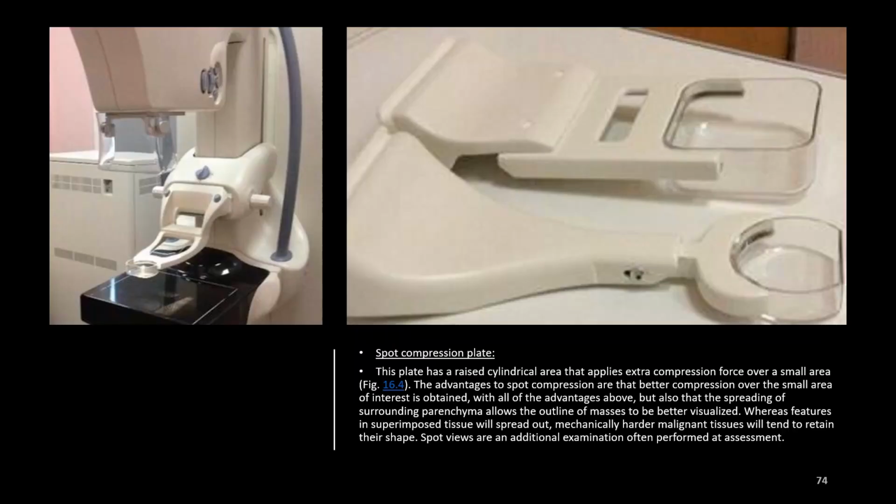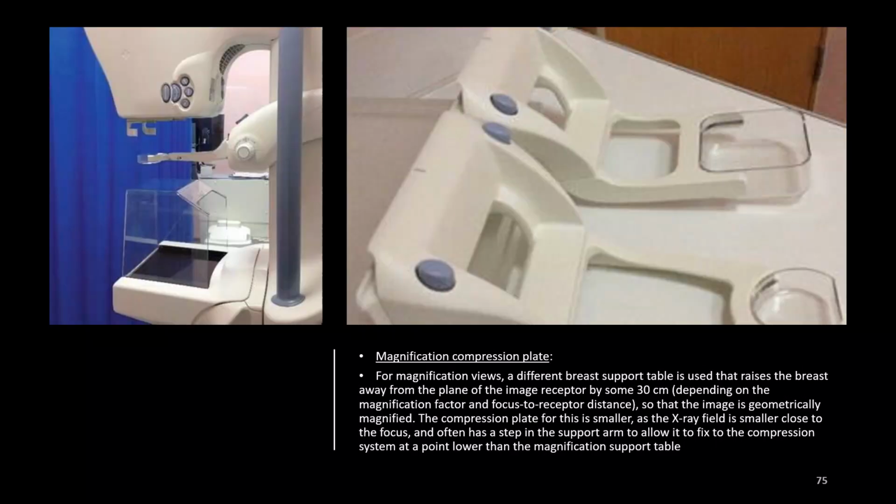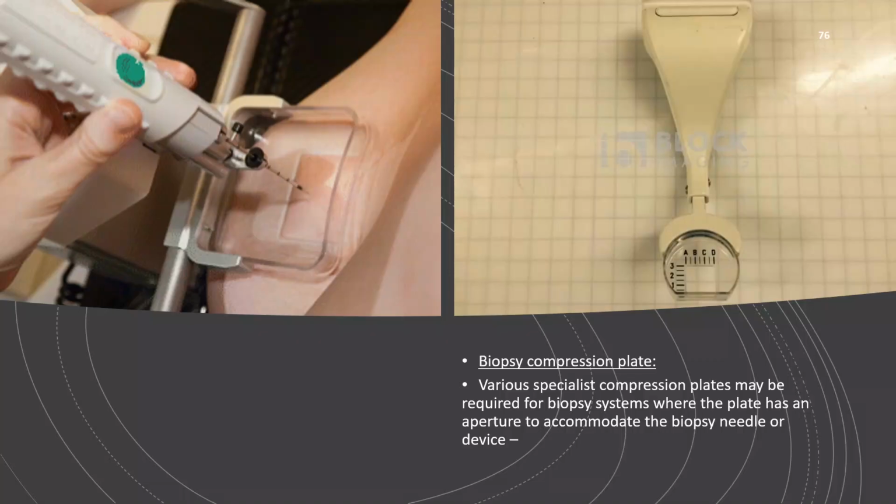Here's a close-up of the spot compression plate. You can have either a cylindrical area or you can have a rounded area. And to the left we can see the setup for the magnification view utilizing the spot compression plate. And as we discussed, we can have a biopsy compression plate as one of the ancillary devices as well.